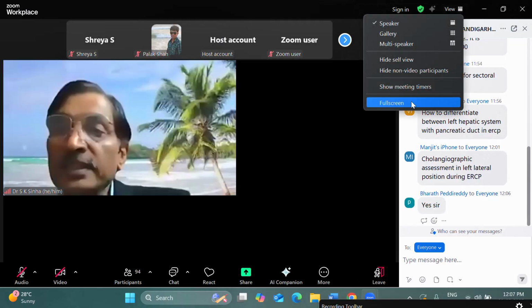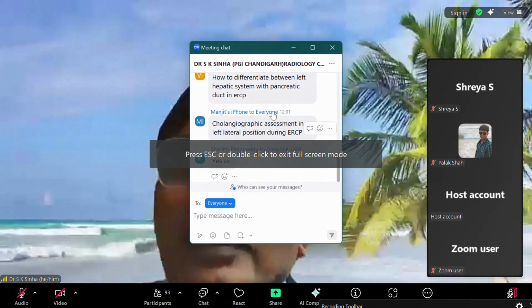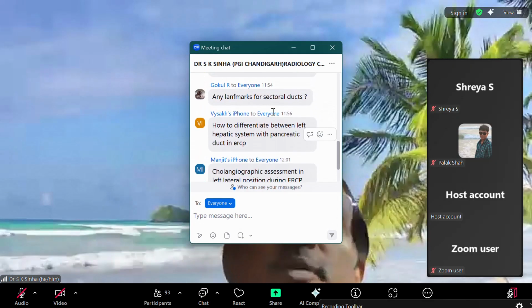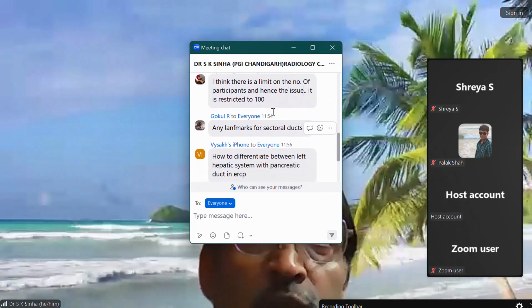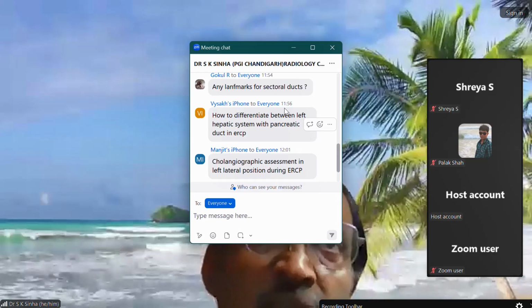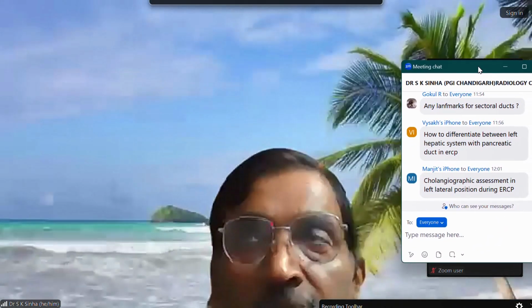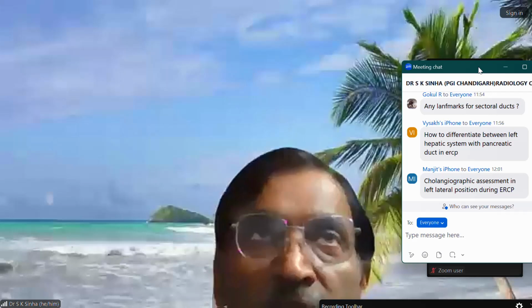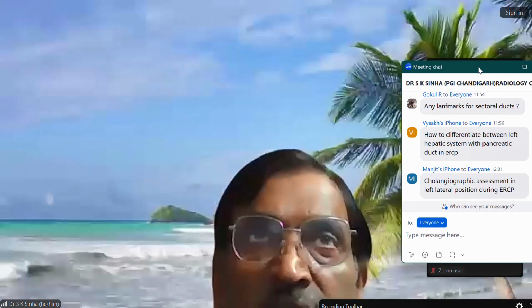So, please guide on calculating the length of biliary stents based on the cholangiogram. This is a very, very interesting question. That is how I explained to you how to take measurement. You have an inbuilt reference, your scope, and you should always take your scope as 12 millimeter. Then you have a reference to compare all other things. So that is how.